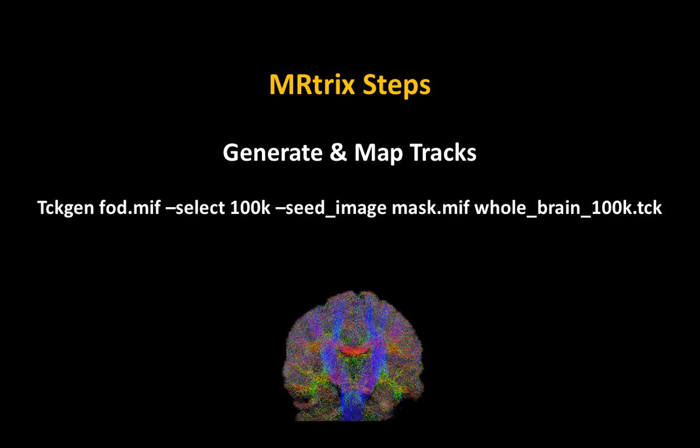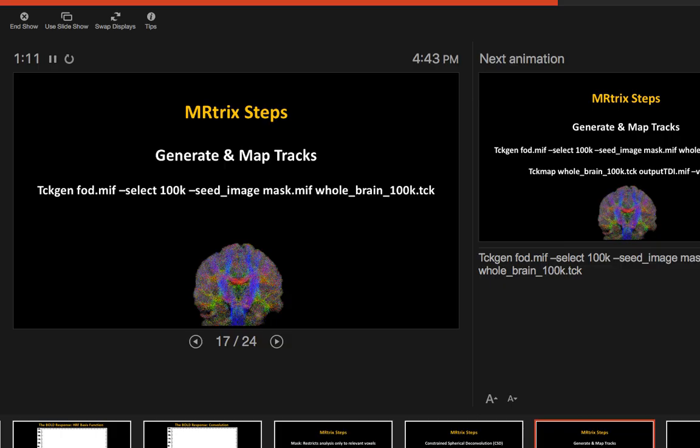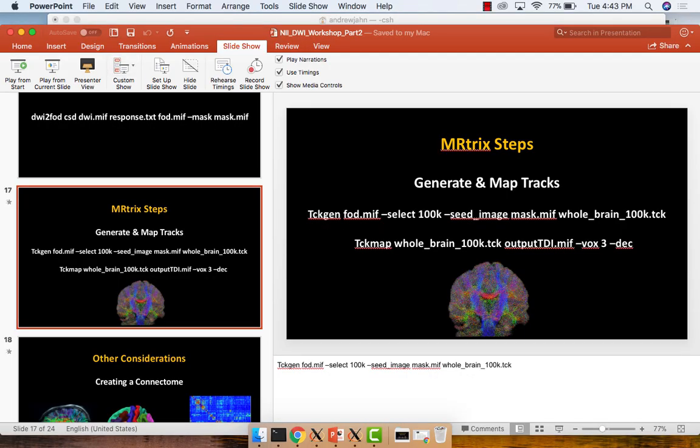So let me run those and show you what those look like. Again, these are not very sophisticated commands. It's really just understanding some of the principles behind it, which takes the most time. So DWI to FOD takes a fair amount of time.